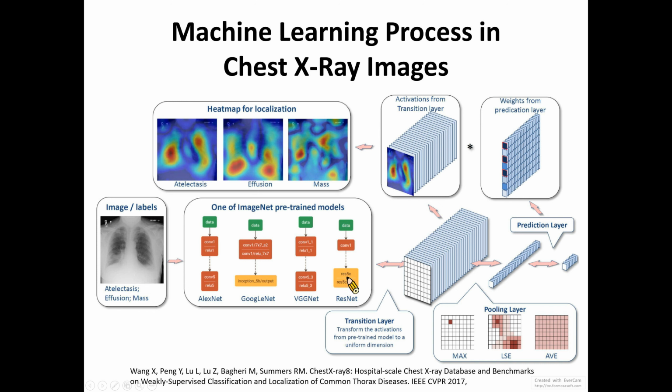So the idea of transfer learning is to use these pre-trained models that, assuming they already have some intelligence, and then we can use that intelligence to learn new things and to reduce our learning time. Okay, so that is the concept of transfer learning I want to show you in this workshop.